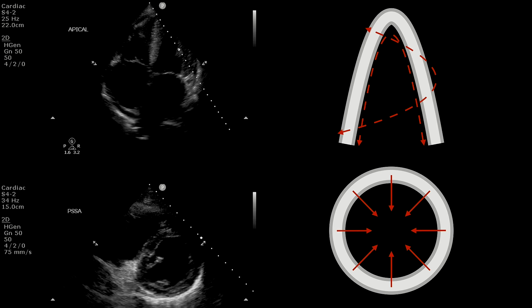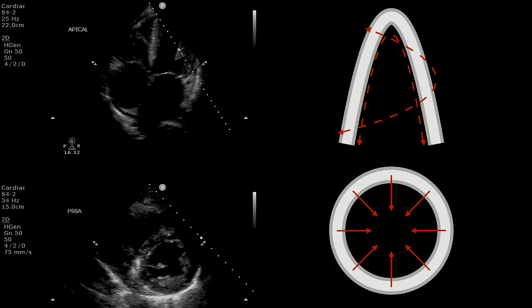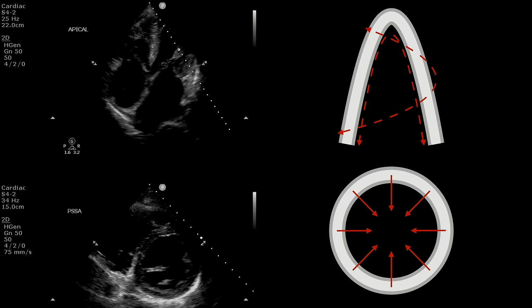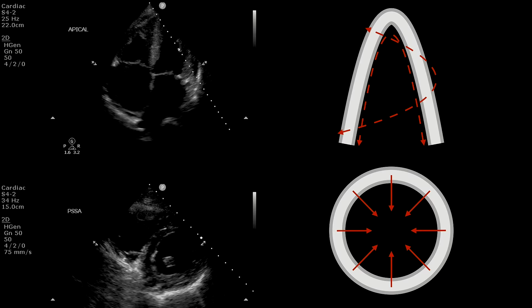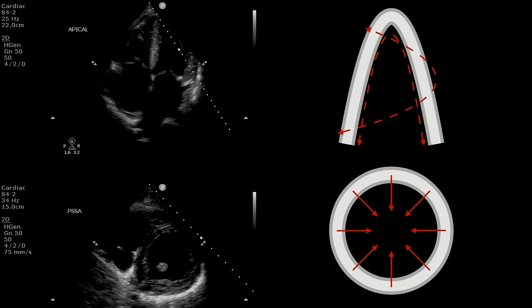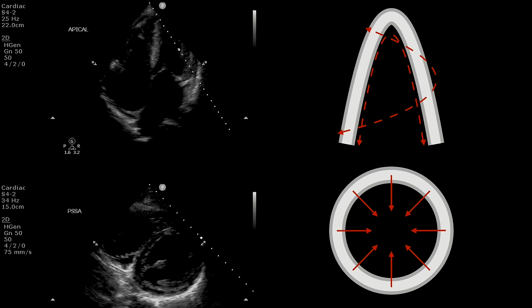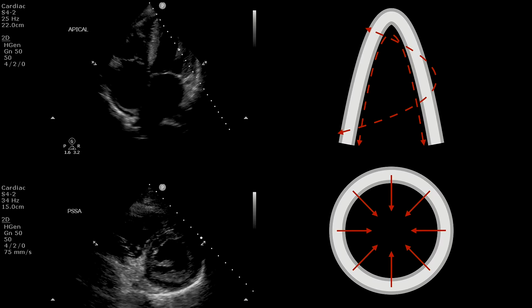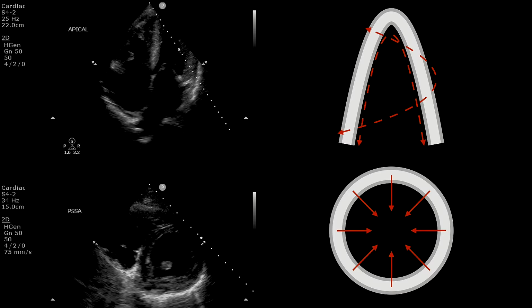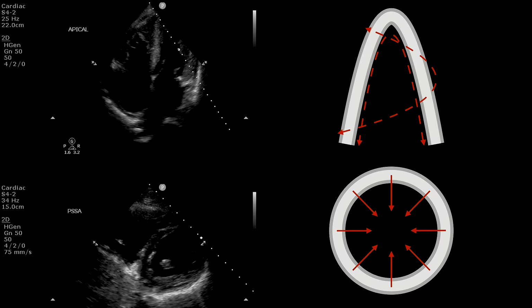As we get into it, let's remind ourselves what is happening in this left ventricle. What are we estimating? I think we have to know what the thing is before we can figure out how to get better at it. When we are looking at this contraction, this left ventricular ejection fraction, we're really trying to estimate the strength of the contraction, how forceful it is and how good it is at getting blood out of the chamber. Remember from last time, we talked about multiple different fiber orientations in the left ventricle that cause it to contract in that fashion of wringing a rag.